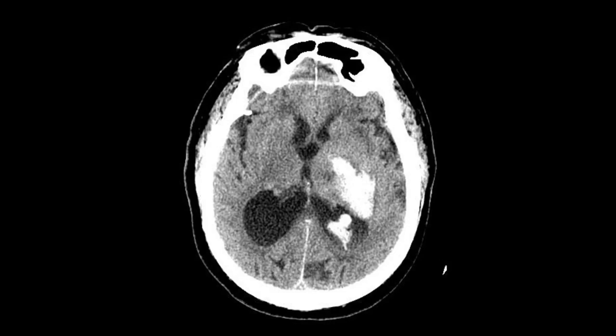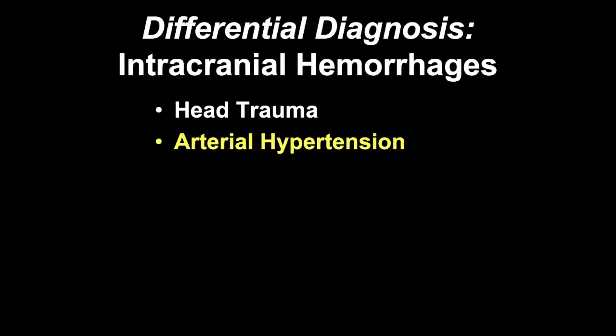So here in that first case, we have a relatively young patient, 40, 50. So that's usually a clue. We can notice that we have intraparenchymal hemorrhage affecting the basal ganglia. There's also probably a little bit of rupture in the choroid plexus. And then we notice that there may be a little bit of white matter disease, but not a huge amount of it. Typically, that pattern, basal ganglia hemorrhage, it could also be lobar hemorrhage, in a relatively young patient, should raise a concern for arterial hypertension. And that's what was the case for this patient.